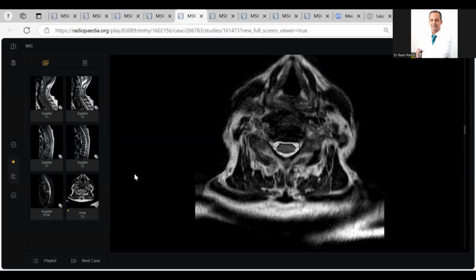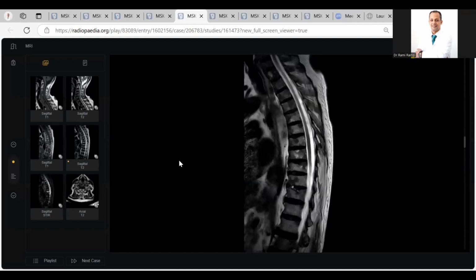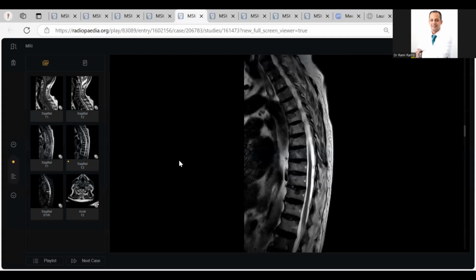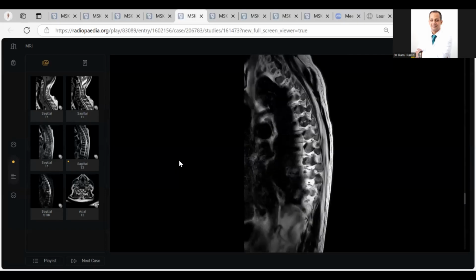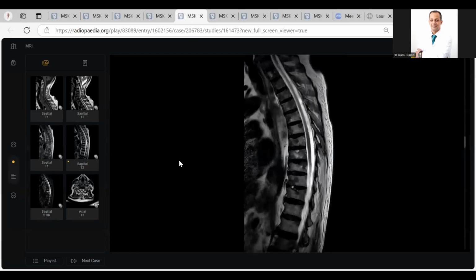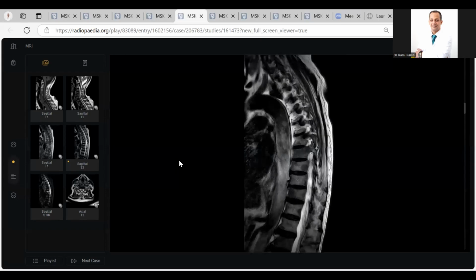They appear low signal on T2, so osteoblastic mets would be the differential. Excellent. Could you tell me the primary? In an old patient, age 60 plus, I think the top differential in a male patient would be prostate. What if the patient is female? Then breast.